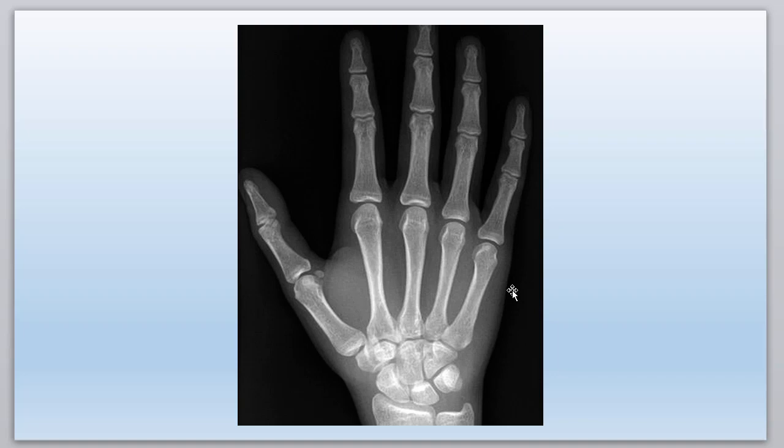In our hand to look at. Okay, let's look through it closely. Whenever I stick something up, maybe there's a fracture here. I don't see any fractures, and that's true. This is normal. That's not a fracture there. It's a little piece of a sesamoid bone. There's a sesamoid bone here, just like on the great toe. Sesamoid bone here. No fractures.